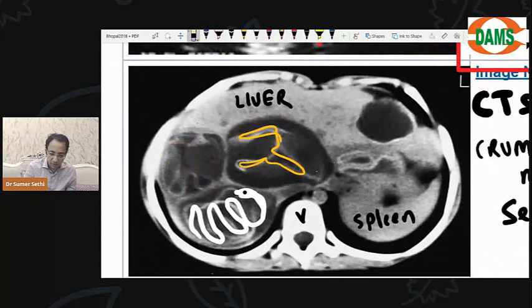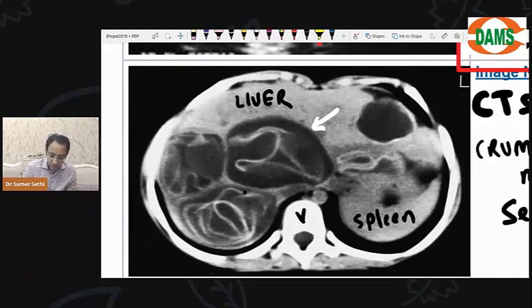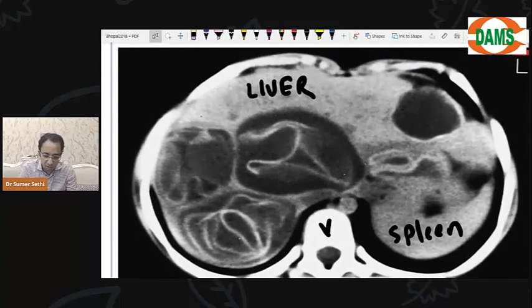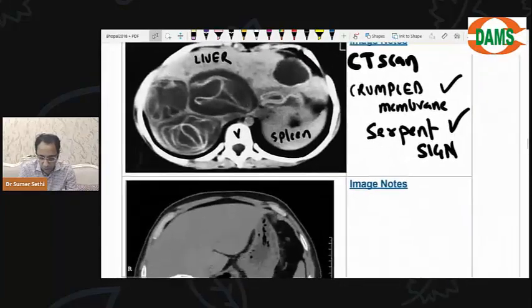It is very simple. If you see a cystic lesion with a central floating membrane, it should make you think of hydatid. So in the exam, the question was simple. Patient has abdominal pain of vague nature. CT scan is shown to you. What is the disorder dealing with? The answer is hydatid. Very good.